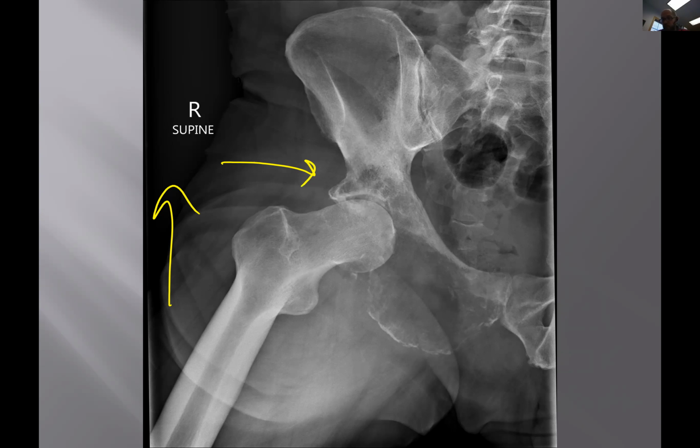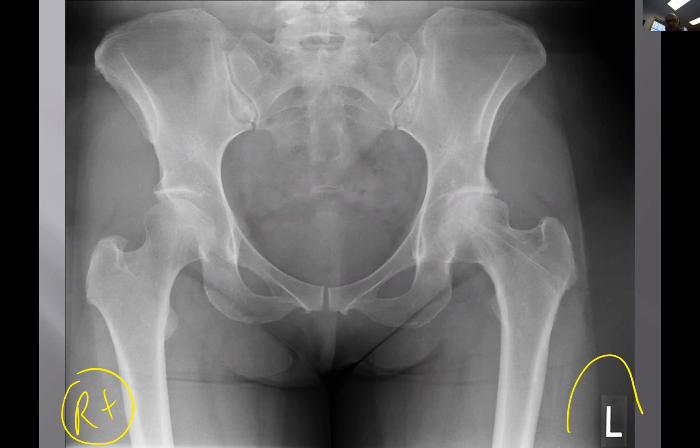One of the worst cases I've seen here in a while of aggressive abnormality. Okay, next case, 47-year-old female with hip pain. All right, now we got the left hip and, of course, right hip. All right, this is for you guys. Unmute yourself and play along. Which hip do you think is abnormal here? Left. Good. Anybody, any other votes? Everyone agree? Left hip being abnormal? Yes. Left. Okay. And why are you saying it's abnormal? Anybody want to play along and give me a little description now of your finding?